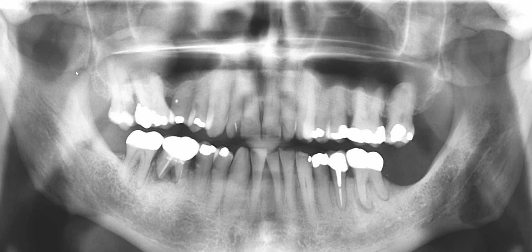and for some reason, it could be positioning, it could be due to various things, this pterygoid plate has a more radiolucent appearance, and if you misread this feature, you could certainly consider fracture, but that's not the case for this patient. Okay, so two important things that you learned: mucus retention pseudocyst and recognizing the appearance and location of pterygoid plates, which extend immediately posterior to the posterior wall of the maxillary sinus.